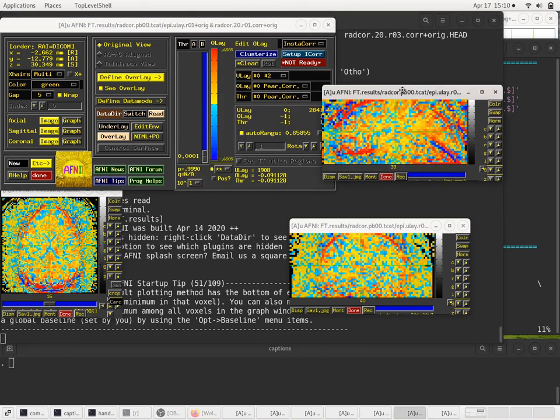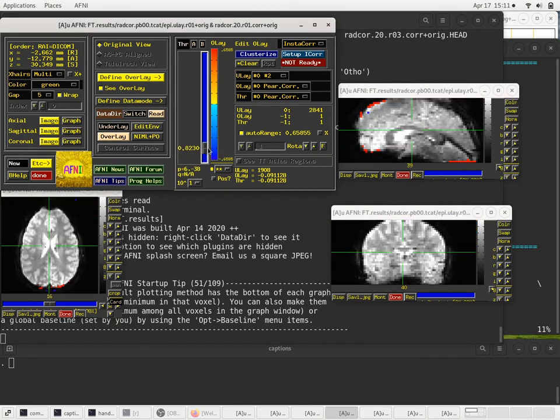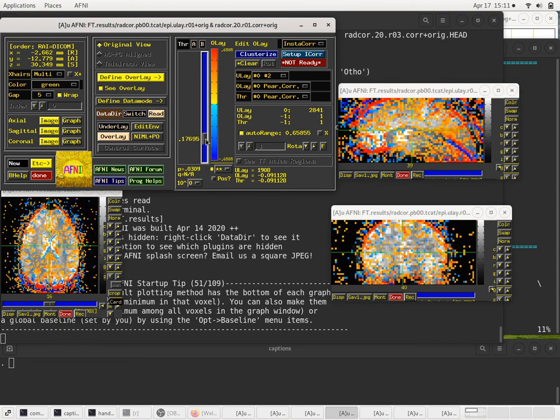And what this does, well, let's do some thresholding first, and then we'll talk more about it. You can see the outline of the brain here right away. If I drag up the threshold a bit, 0.8 becomes immediately too high. And you see that we probably don't want to use the scaling of 10 to the first, which goes from 0 up to 10 to the first. Let's change it to go from 0 to 10 to the 0, so that's a 0 to 1 range, and that's more reasonable since what we're looking at are correlations. Now if we drag the threshold up, it's a little more usable. We don't have to be so precise.